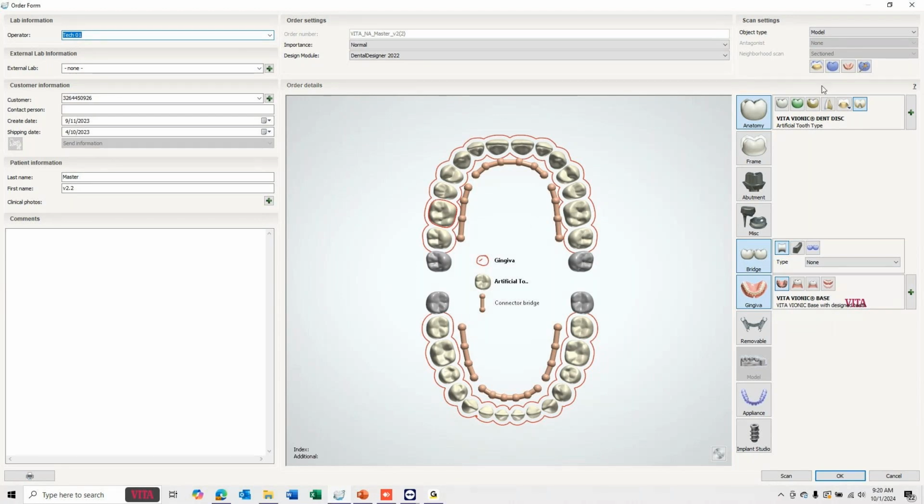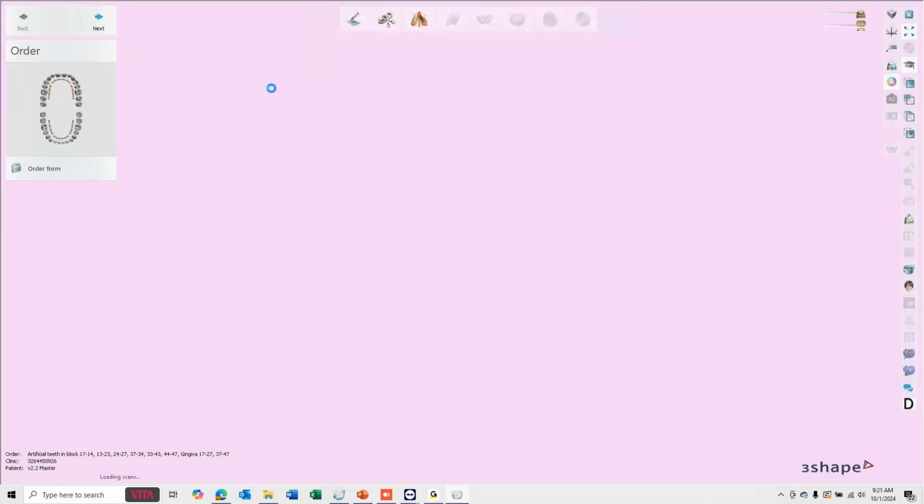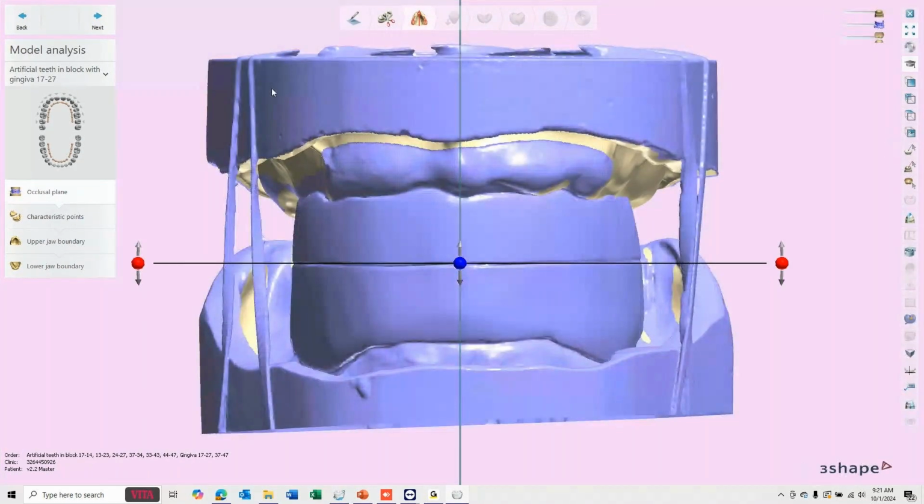If you want to add additional scans, like a pre-prep scan or something like that, you can. I didn't in this particular one. So let's go through and I'll show you what it looks like. Now I've already done this one, so we're just going to step through it. And mostly in the interest of time, I want to show you all the different pieces of this. And like I said, I'll be doing more workshops, webinars, and stuff on all the individual parts. So if you want to go more in depth, let me know, or come join me in one of those, and we can definitely go in more depth on the different steps.